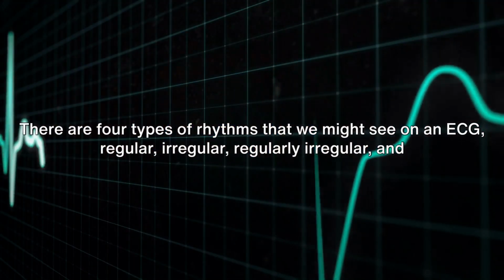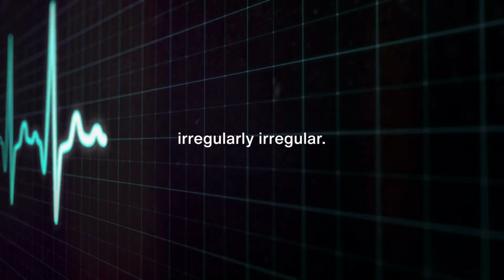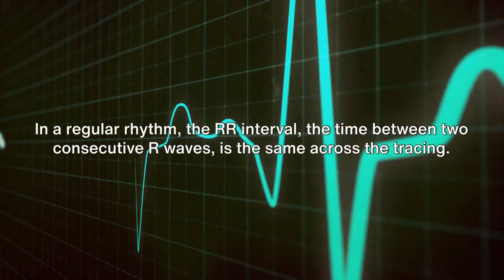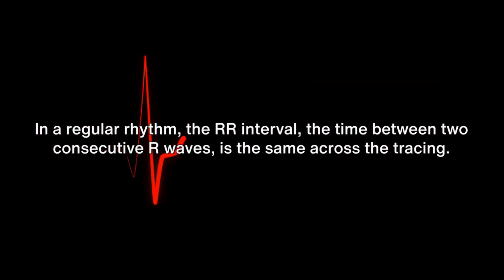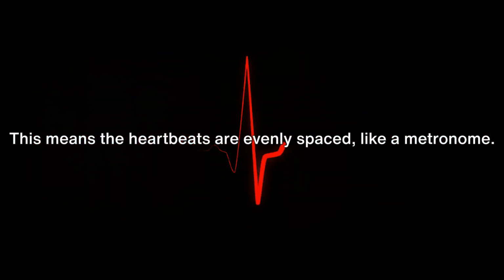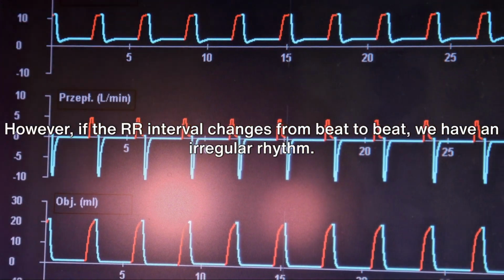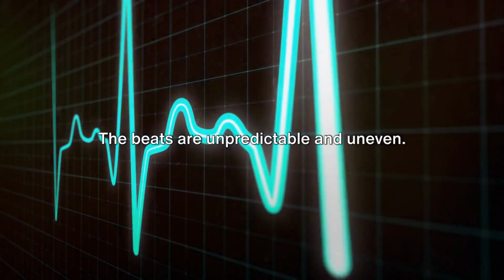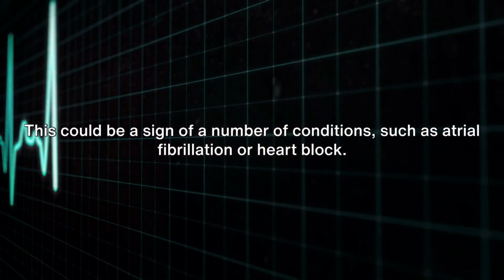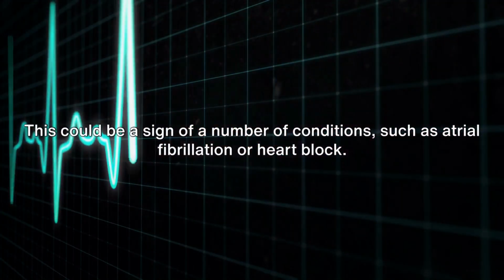There are 4 types of rhythms that we might see on an ECG: regular, irregular, regularly irregular, and irregularly irregular. In a regular rhythm, the RR interval, the time between 2 consecutive R waves, is the same across the tracing. This means the heartbeats are evenly spaced, like a metronome. However, if the RR interval changes from beat to beat, we have an irregular rhythm. It's like a drummer who can't keep time. The beats are unpredictable and uneven. This could be a sign of a number of conditions, such as atrial fibrillation or heart block.